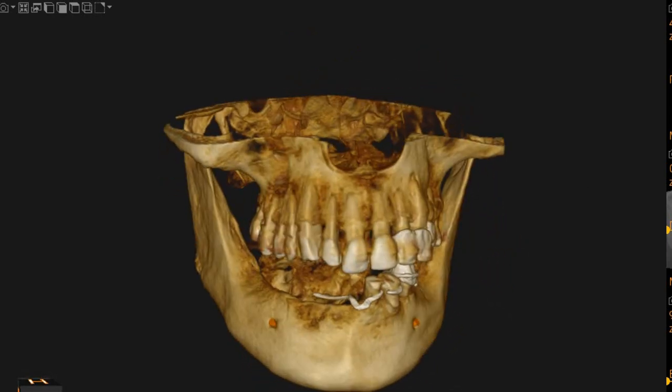Now moving to the transaxial view. The transaxial view is basically the proximal view. Here we will be able to show our doctor how the ridge looks. The anterior part of the ridge is D1 quality of bone. You can see that there's all cortical plate.